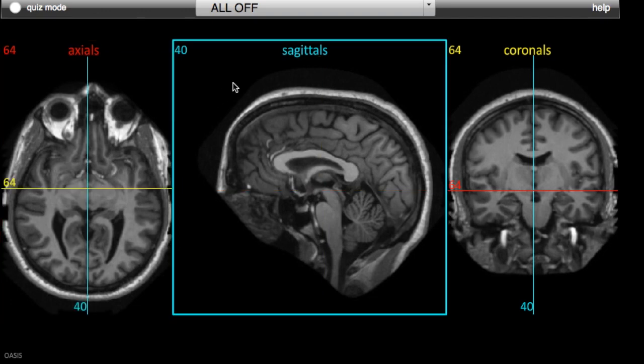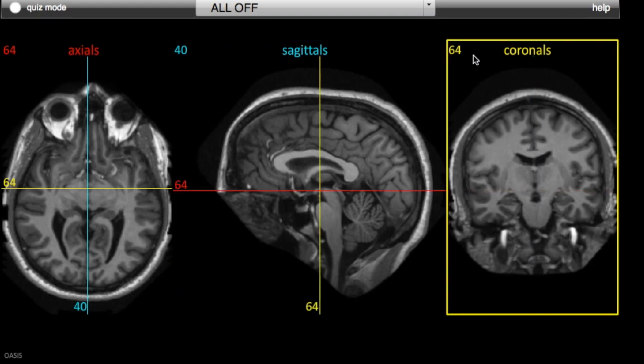For reference, in the middle we have sagittal sections, which for the purpose of this video will stay the same. And on the far right we have coronal sections, which are not that high yield, but I'm going to be using the coronal plane to affix our height on a superior-inferior axis. And you can always tell where the axial section is taken from by following the red line across.